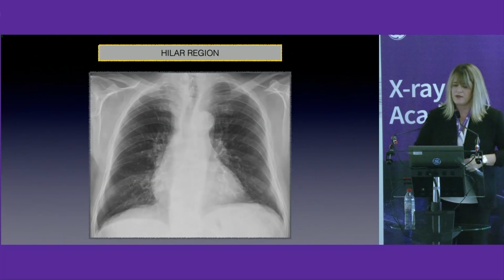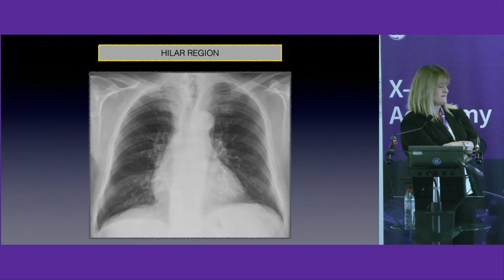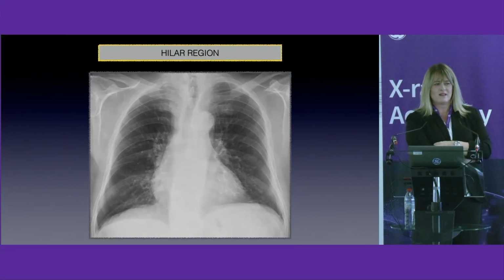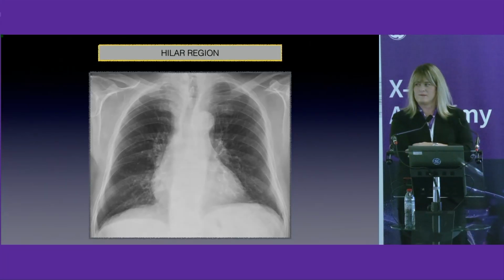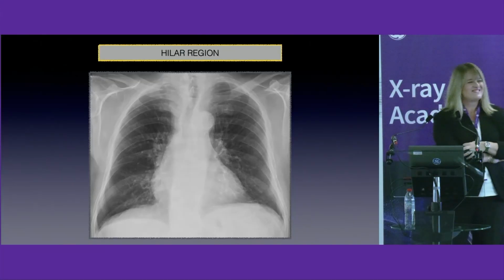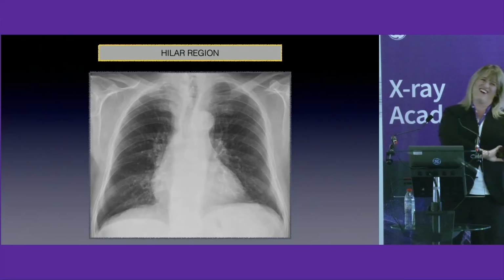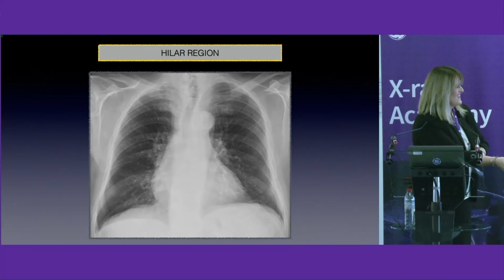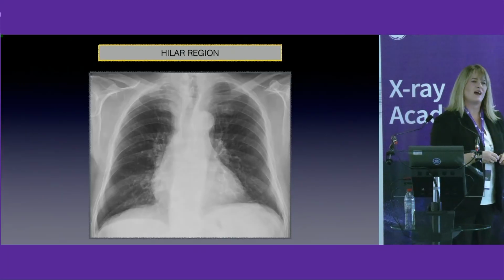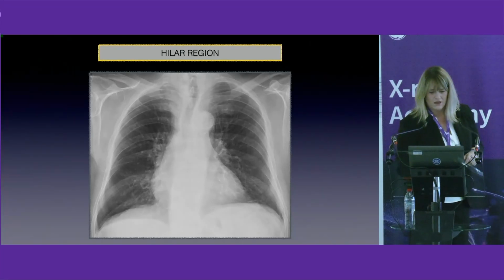But what about this patient? Any idea? Is everything normal? No, please. Right apex. So you mean here?